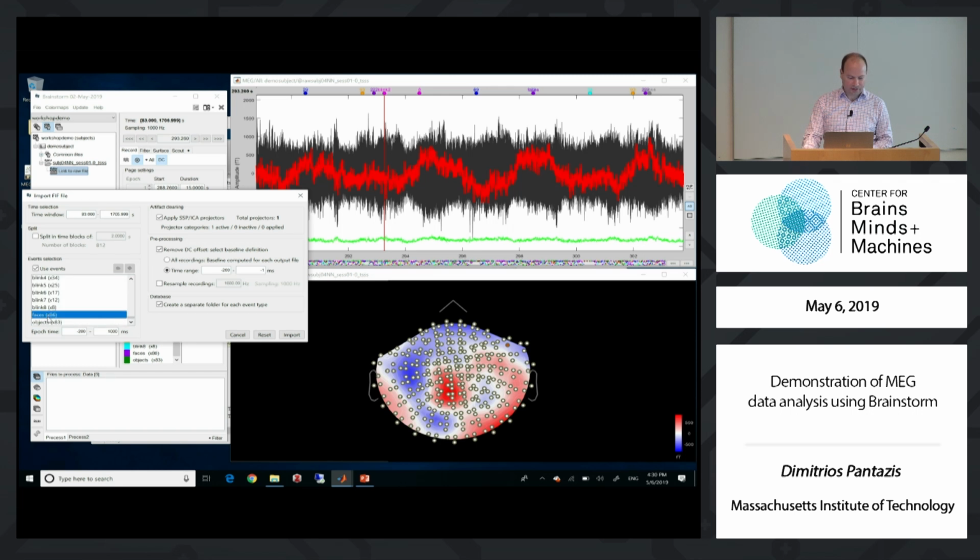and I will select only these two events to import. The epochs that I will create is -200 from the presentation of the stimulus until 1,000 milliseconds after the presentation of the stimulus, and this will be my epochs.